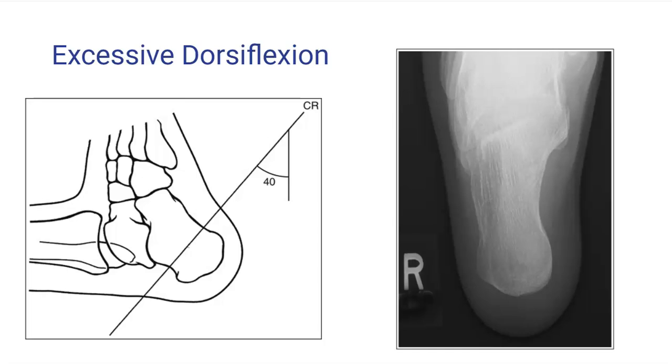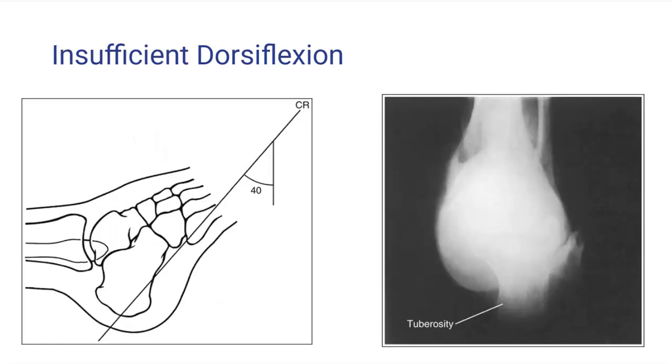So remember, we're trying to open that talocalcaneal joint, so we need to ensure that the foot is at that 90-degree or vertical position with the IR. Now conversely, when the foot is in plantar flexion, this describes patients who have probably sustained trauma to the calcaneal tuberosity. Often they'll struggle to achieve that full dorsiflexion to 90 degrees with the lower leg.